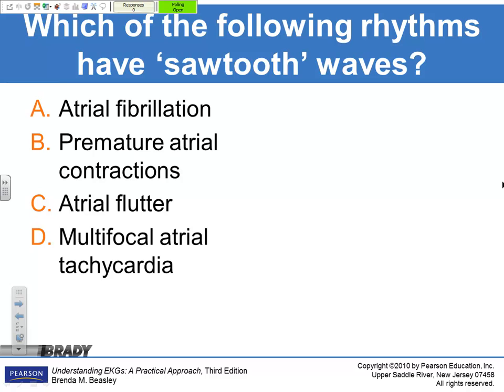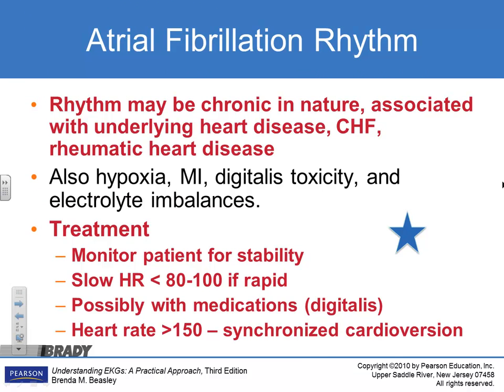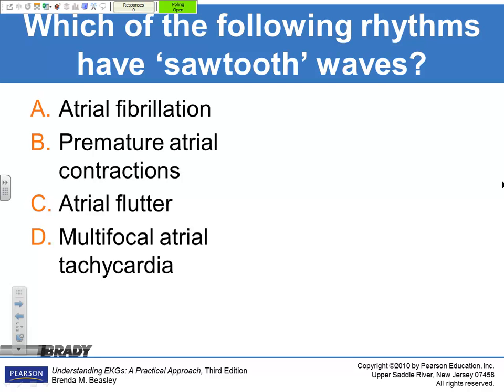All right, y'all got that? Oh, I had a question. Did I have a star up there? I did. Which of the following rhythms have sawtooth waves?